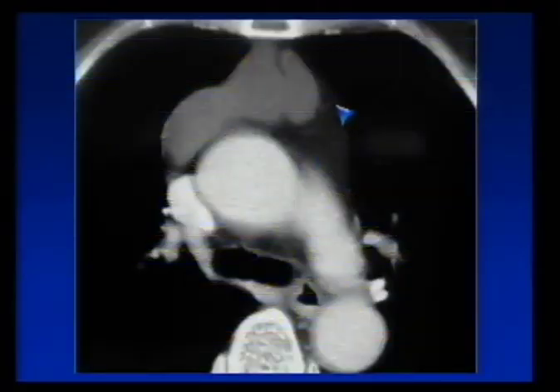Okay, so how about this particular case? It's an anterior mediastinal mass. It's homogeneous but lobulated. What could this be? Differential diagnosis is what? Not too difficult a case, at least in my opinion, probably because I already know the case. Okay, so thymoma, lymphoma, those are probably the two most likely things. This turns out to be a thymoma. In older patients, I would say, include thymoma in the differential. If this were a 20-year-old, I would be worried more about lymphoma than thymoma.